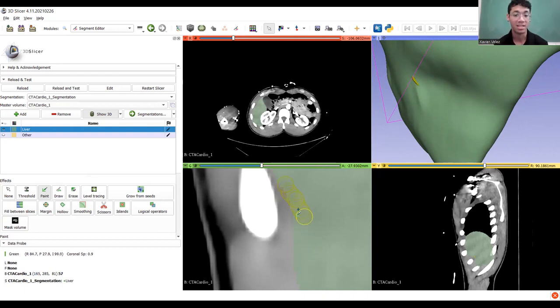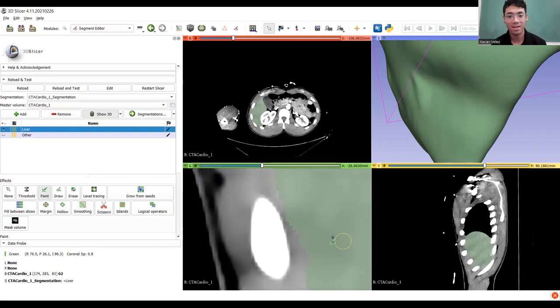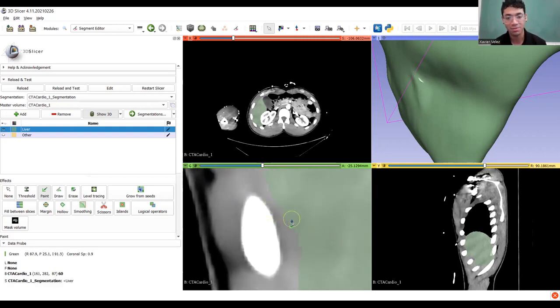So if you're at this step and you want to edit things and you're not really sure if it's going to look good or bad, but you'll give it a shot, then I'd recommend saving your STL beforehand and then going in and doing some of that manual editing. You don't want to get in a position where you edit things and it makes it look worse, because that sucks. And at the end of the day, I'm a firm believer that anything can be fixed with way too much smoothing.